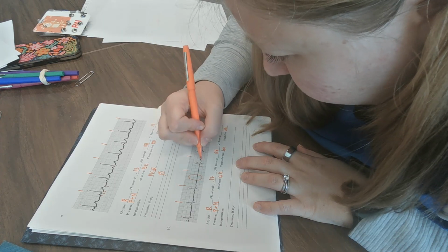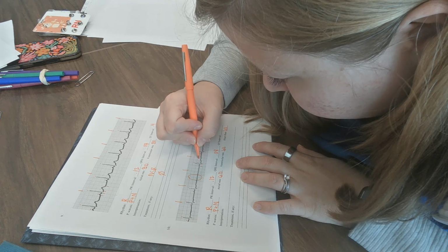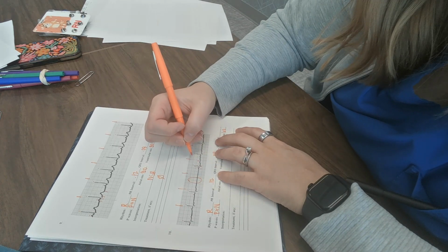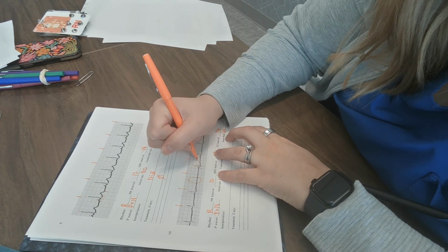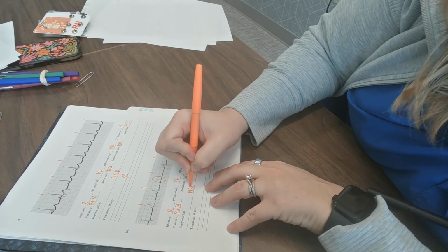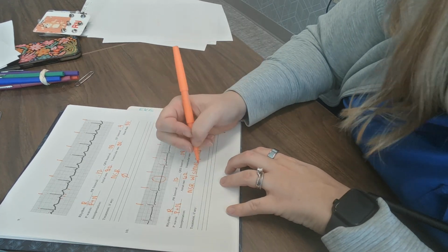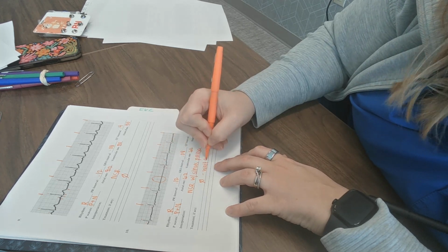And then my T wave is really kind of difficult to see, but it's going to end right here. Okay, so that's going to be 1 big box plus 3 plus 1. So 0.36, because it's 0.2 plus 0.12 plus 0.04. It's going to give you 0.36. So this is normal sinus rhythm with a sinus pause. Okay. This one you're probably not going to do anything about. You're just going to wait and watch.